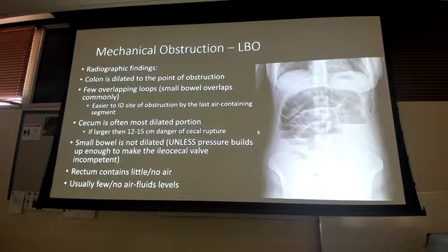Do I have some small bowel dilated here? What do you think? I think so. If you look behind, right, I can see some of these valvulae conniventes coming over. So I think this is backed up to the small bowel, and then maybe some air fluid lines sitting right down in here. So it's very possible that this also involves some small bowel too. But understand that it doesn't always have to. It just depends on if pressure's built up enough to go past that ileocecal valve and start going to the small bowel. On your severe obstructions, a lot of times it will. Okay?